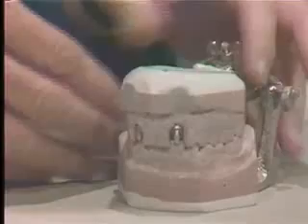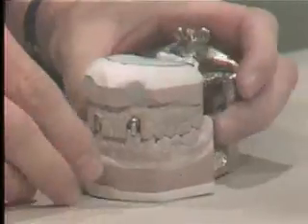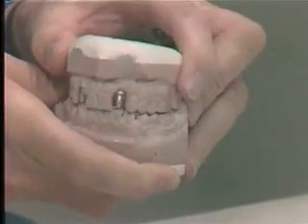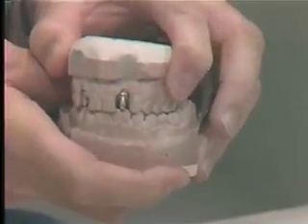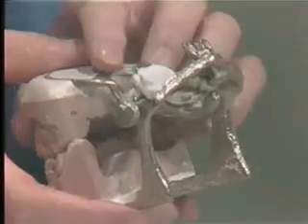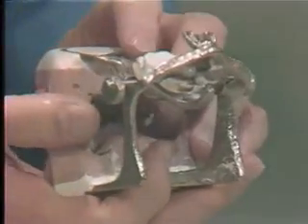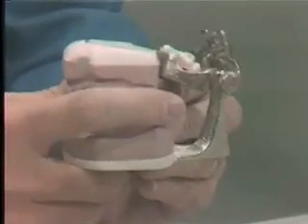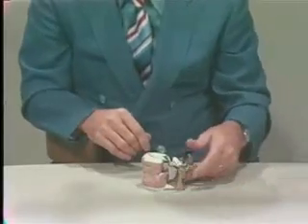It's exactly the same thing as the last one we showed you, except then of course you have guidance from both sides, and the guidance is predominantly from the teeth, as you can see if we move it slightly. And you have slight protrusive movement, and you do have some control over the closure. However, these rely on the teeth and on your knowledge of what you would like to gain at the end of whatever you're going to do with this articulator, rather than on the articulator being a direct guide.